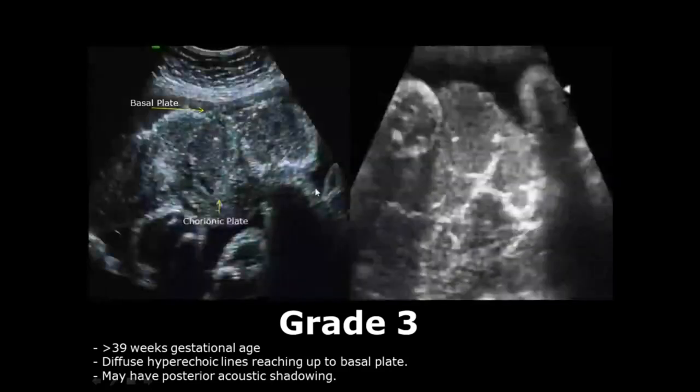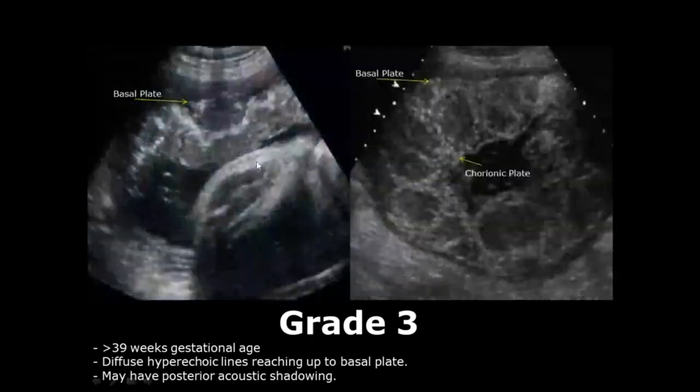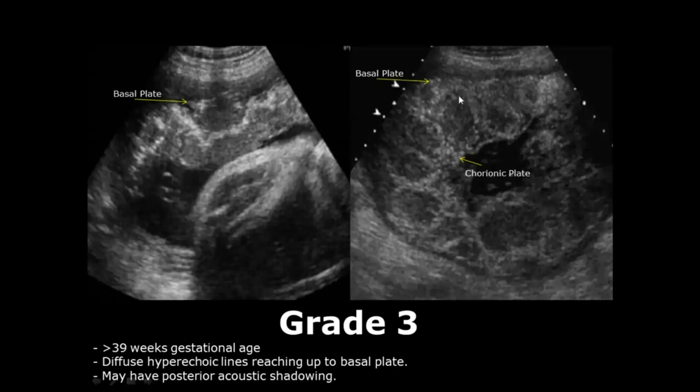Here are more images showing grade 3 placenta with diffuse calcifications and hyperechoic areas throughout the placenta. Here are more images of a grade 3 placenta. If the placenta shows this type of appearance, let's say for example 20 weeks or before grade 3, that is before 38 or 39 weeks, this may be a sign of placental insufficiency.